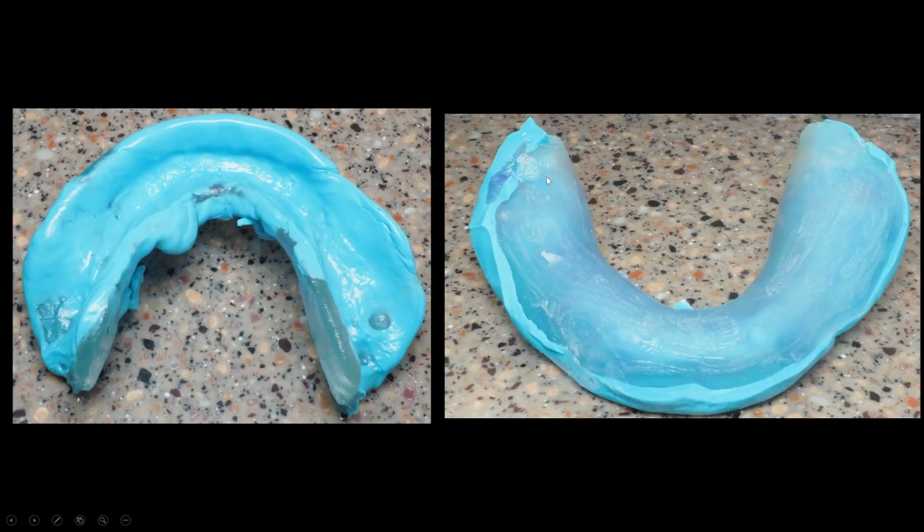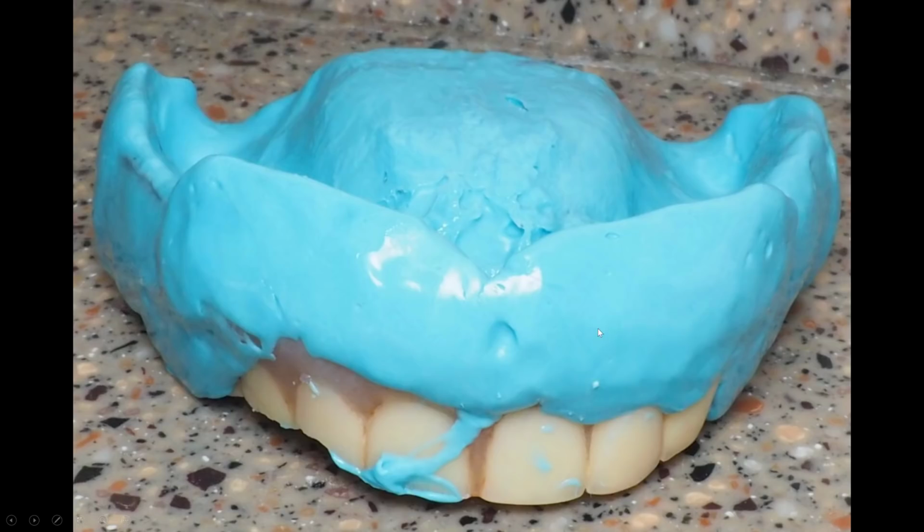What I often would do back when I was doing dentures is, after doing the initial impression, I would cut the handle off and immediately turn this into a chairside bite rim. You'll never have a better fitting bite rim than what you're going to have with this PVS intraorally relined impression. You can see them using some stock trays that can be customized, like the Joe Masad trays available from Nobilium. You can use these and cut the handle off after the impression and then add wax and simply use them as a bite rim.